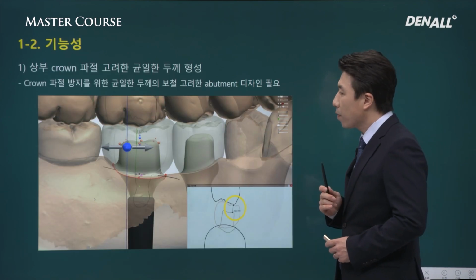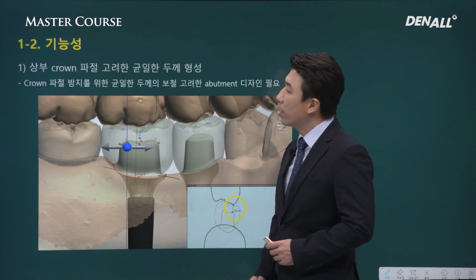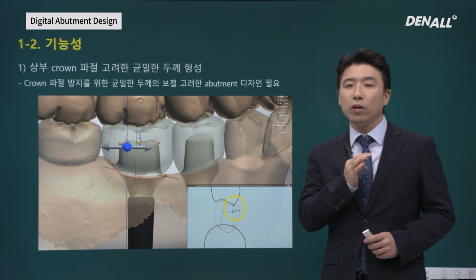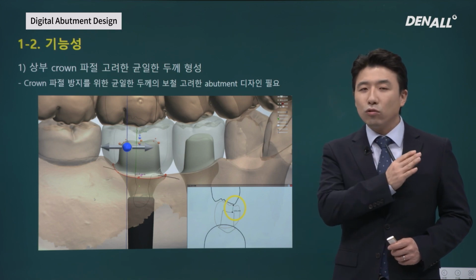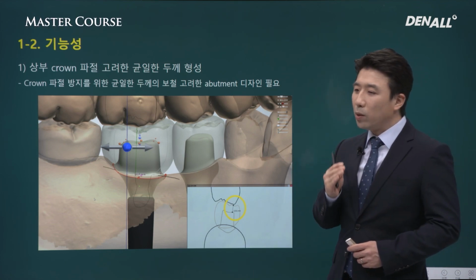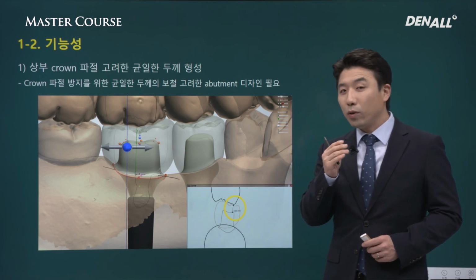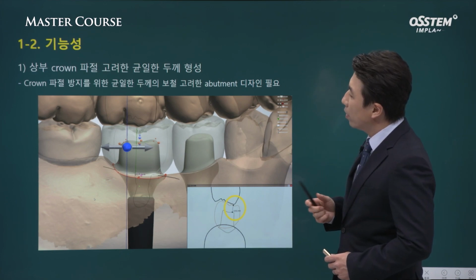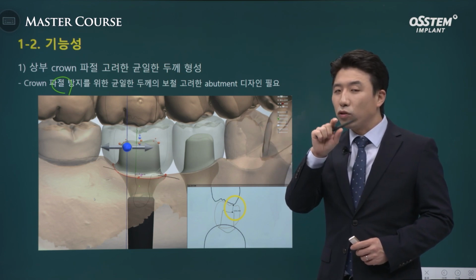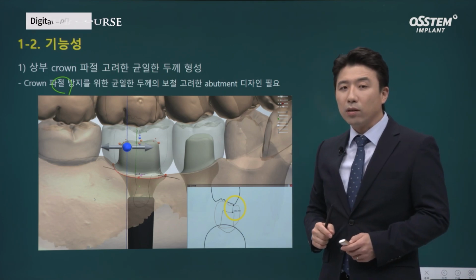I want to go into each in detail. We talk about 2 millimeters in basic. We use zirconia frequently when applying insurance. PFM is used. For PFM crown, if it is porcelain occlusion rather than metal occlusion, it requires about 2 millimeters. 2 millimeters of gap is made. If you use metal or gold, then it can be shorter, but in order to prevent crown fracture or other issues, we need to consider the prosthesis thickness. And we need to make sure that the thickness is even. On the design, these can be very important.